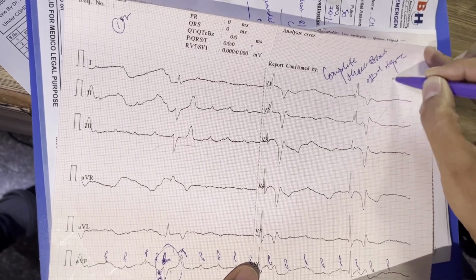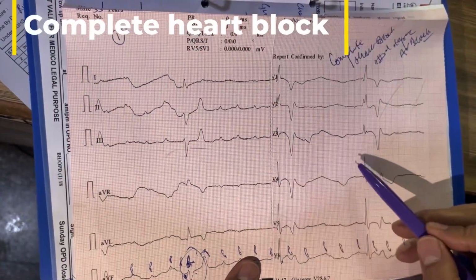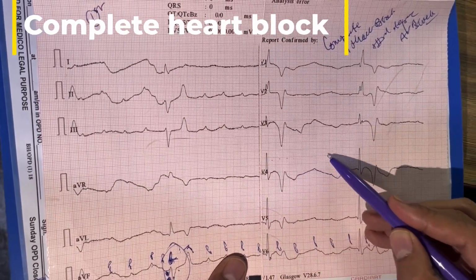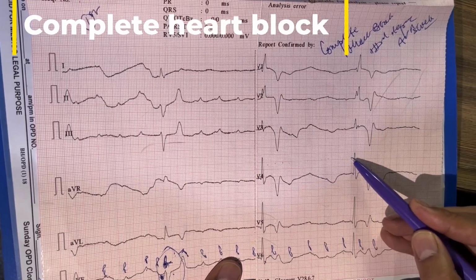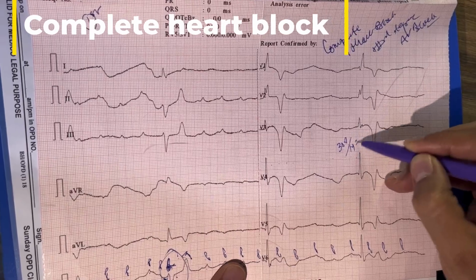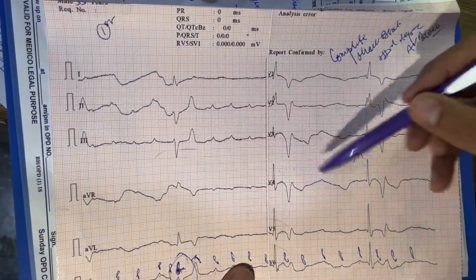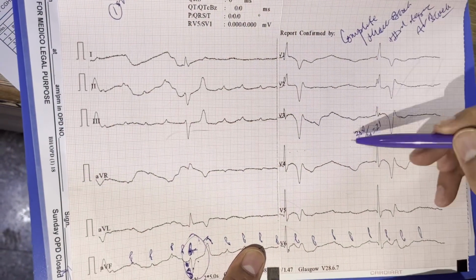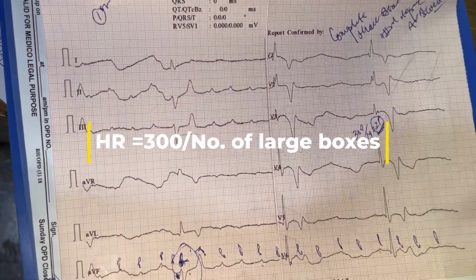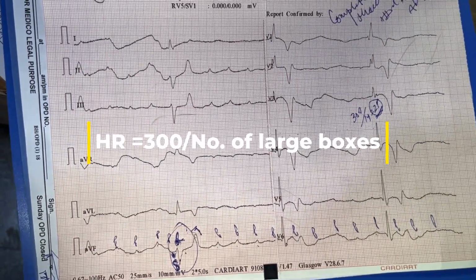Third degree AV block. And how do we calculate the heart rate? We calculate the heart rate by larger squares. You can see 1, 2, 3, 4, 5, 6, 7, 8, 9, 10, 11, 12, 13, almost 14 squares. So when you divide 300 by 14 bigger squares, the heart rate comes around 21. Or you can do the other way around: count the smaller squares and divide 1500 by the smaller squares, and you will get the heart rate. So this patient had a heart rate of 21, and the patient was in cardiogenic shock and congestive heart failure.